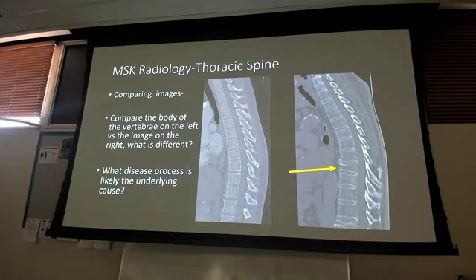Okay, what's this abnormality? Positive yellow arrow sign. That's not the diagnosis. Compression fracture, right? Shortened vertebrae compared to the other ones. Coming in there. Doesn't look like a little bit on the bottom too, but coming in there. And then therefore a disease process is most likely osteoporosis.